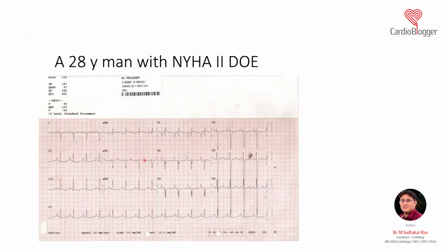Now let's go to the axis. Most of these ECGs have a right axis deviation. Lead 1 is negative, aVF is positive. It means there is a right axis deviation. The most prominent thing is there is almost a 3 mm P wave which is positive, an upstroke. So it is a P pulmonale. So there is definitely a right axis deviation and right atrial enlargement in this ECG.